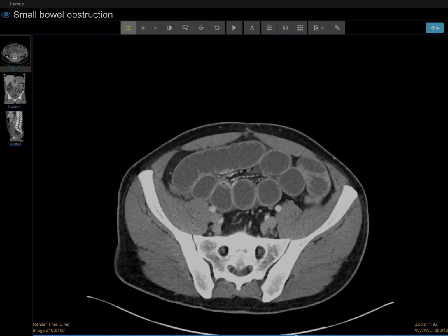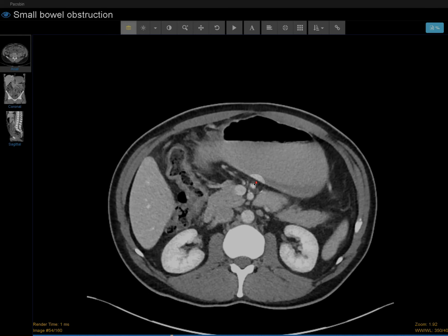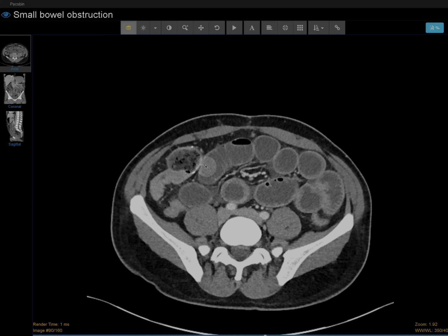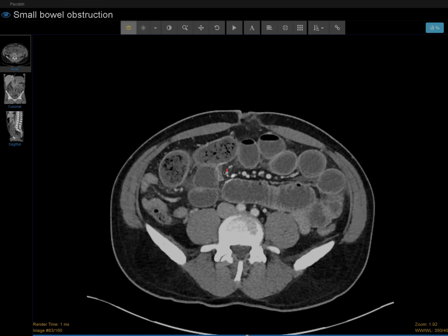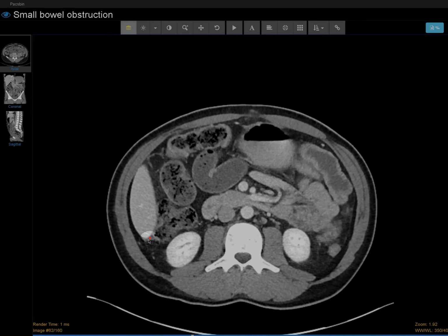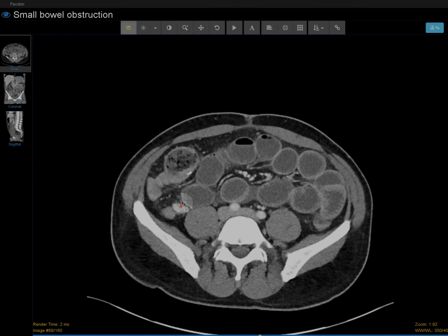Usually, I don't really measure bowel loops. Just grossly looking at it, this is dilated. Like if you have been looking at my other videos that I've been making, just compare the size of this bowel loop to bowel loops on the other CTs, these are abnormally dilated bowel loops. And there is some fluid here tracking down the liver along the right paracolic gutter.